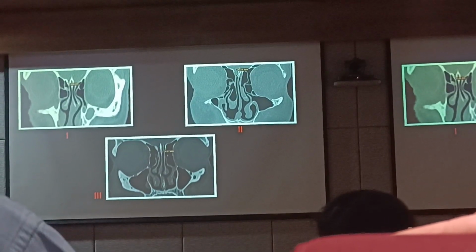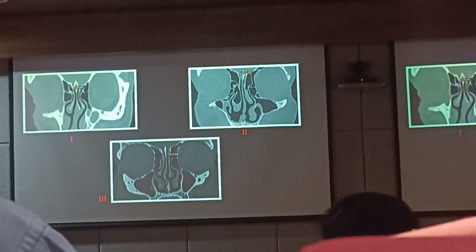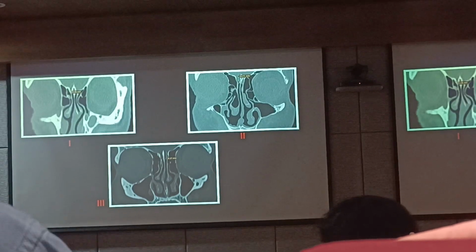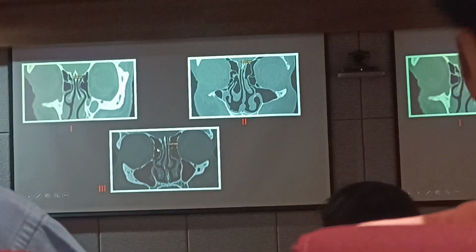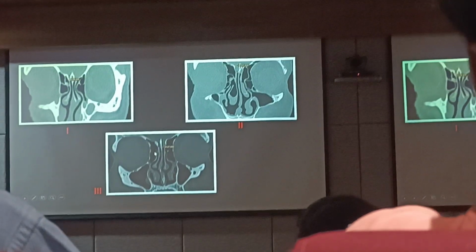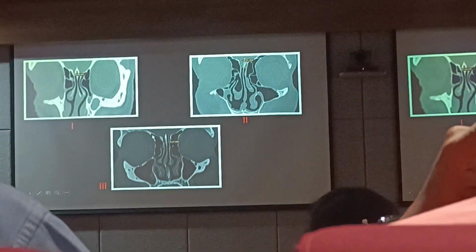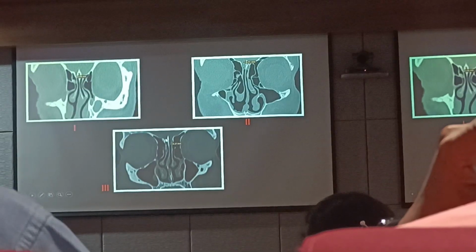You are going to be surely in your frontal recess if you stick between the orbit laterally and the lateral lamella of the cribriform medially. So when you take your suction, you won't go straight on like this towards the lateral lamella. What you do is take your suction and go a little bit here into this groove. You have to watch this opening and go into this area. If you go here, you're going to damage this and cause a CSF leak.